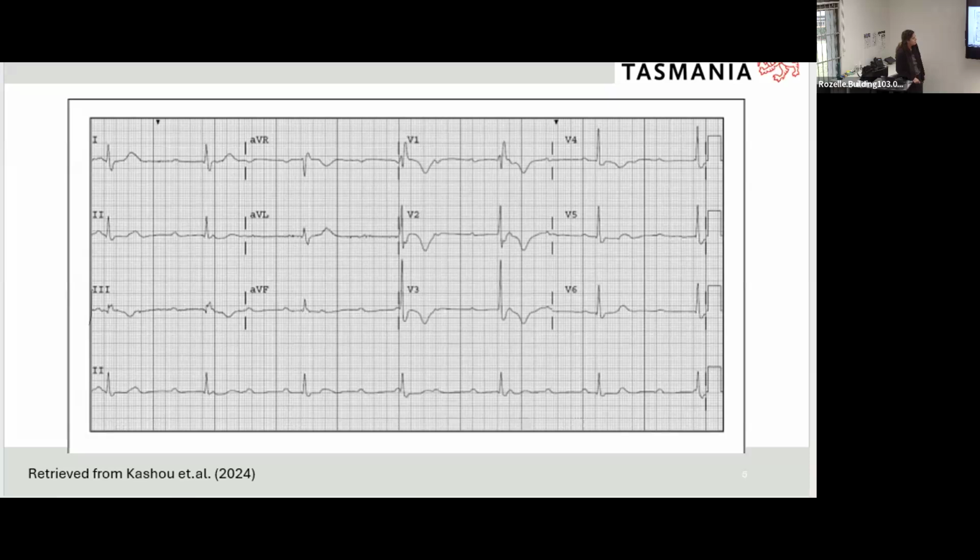Would this be best to use when calculating? Yes. Okay, so we've got about 40 beats per minute from everyone using a 6-second method. Is anyone getting anything different? Yep, so we got 40.